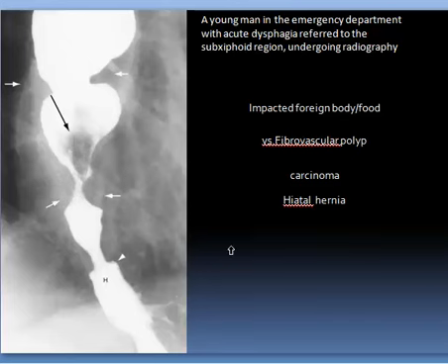And don't forget that once you see a foreign body, there should be an explanation why it is here. Why it is here could be due to malignancy, or due to muscular incoordination, either achalasia or skeletal.